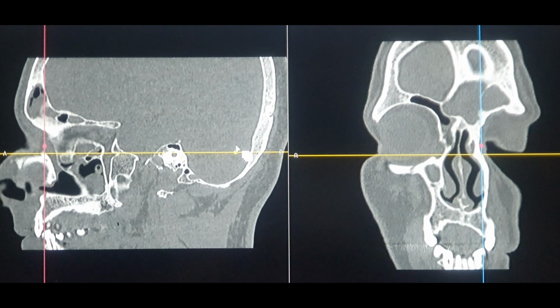Now this was a very unique case for me because when I had to read the CT scan twice or thrice, I understood that it is not the type 4 Kuhn cell, but it is actually a huge interfrontal sinus septal cell which is actually opening on the left frontal recess. It is not opening in the right, but it is actually opening in the left frontal recess, which I'll show you in some time.